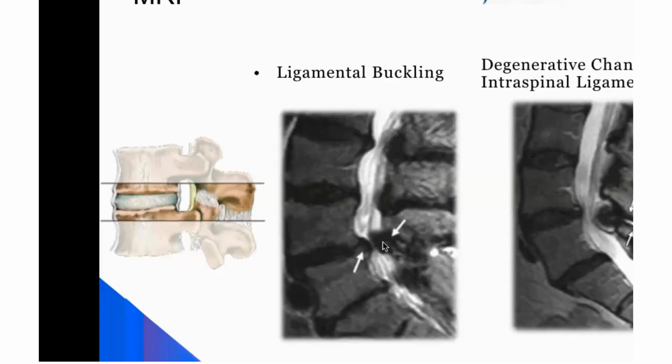Again, you can see the ligament buckling over here. Because of the thinning of the space, it will start putting pressure on the facet joints, and there's a reduction of space, and this ligament will start buckling inside, and that will start compressing the nerve. So there's one technology for this kind of buckling, called interspinous spacers. Still not available in India, but that technology is available, where you can go for the interspinous spacer. We just lift this interspinous space, and this joint will get straightened up.